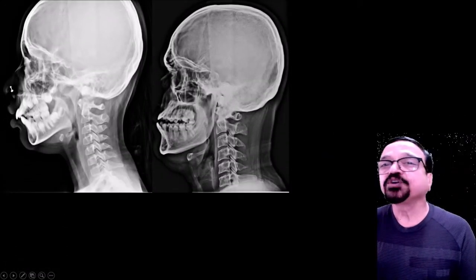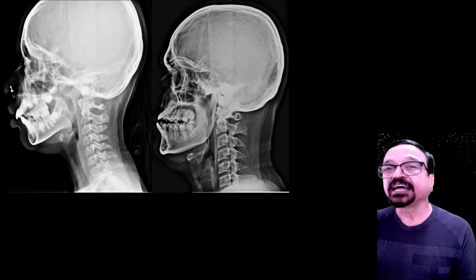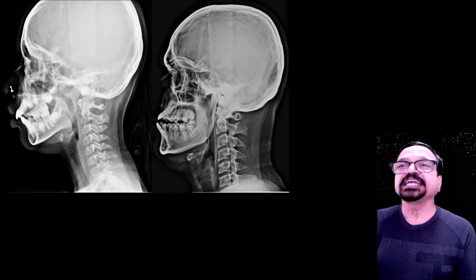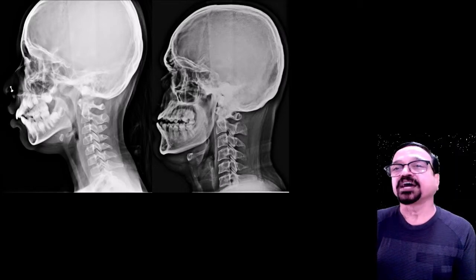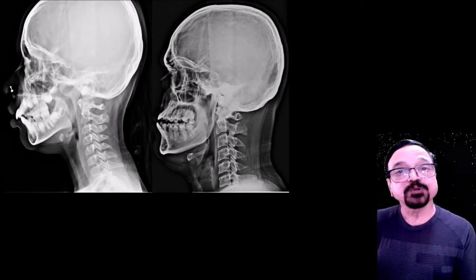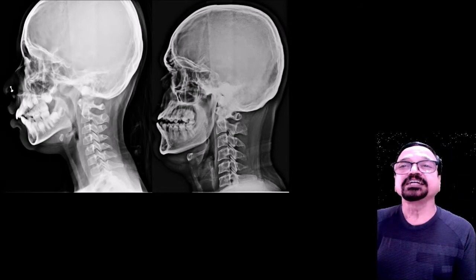Now we are showing you two mandible laterals. One is a soft tissue mandible, and second you have the normal mandible lateral. What you are seeing is the TM joint, then the neck of the mandible. These are best seen in this lateral. Then you are also seeing the molar region, that is the first, second and third molar, and then you are seeing the submandibular region. So soft tissue exposures are taken when submandibular pathology is suspected. Otherwise, if bony pathology is suspected, then you go for just the straight lateral view.